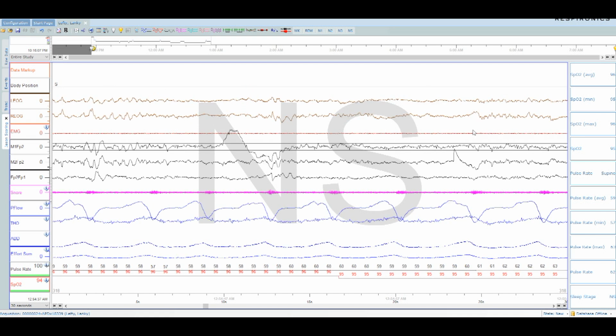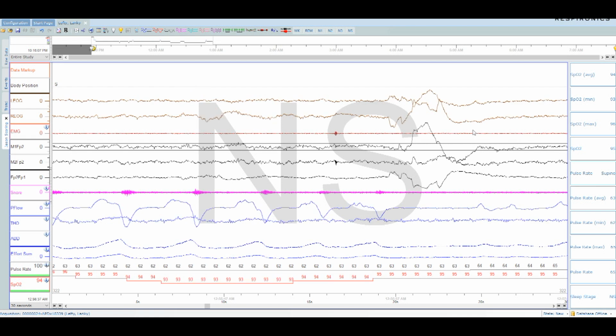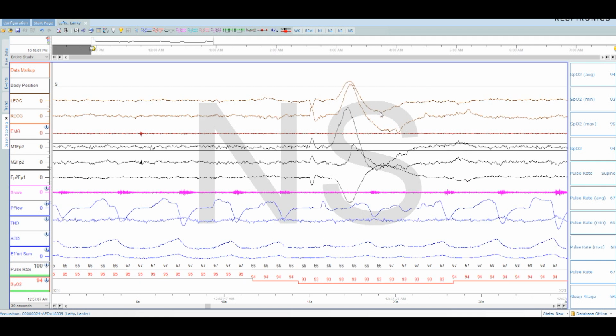Okay, it is getting to be past the time we'd expect REM. This is looking very REM-y. It's starting to appear, and there we have it. So we have these non-synchronous eye movements going in opposite directions. That's my little eyes looking different directions. I believe that's, yeah. And then we're pinching in right here. So this is definitely REM.